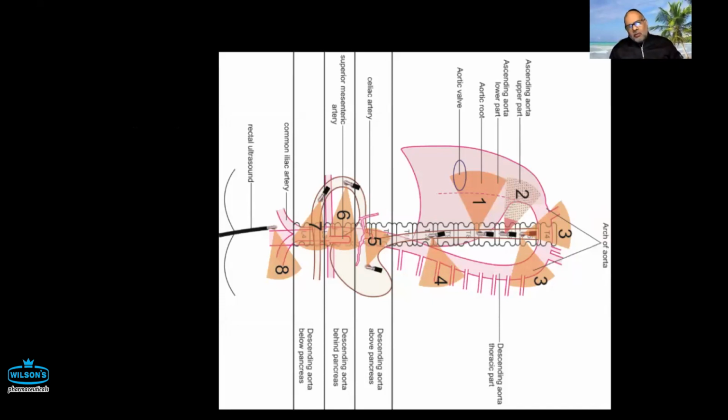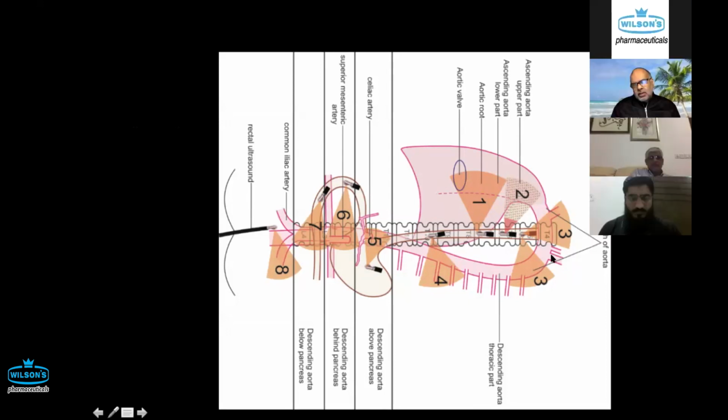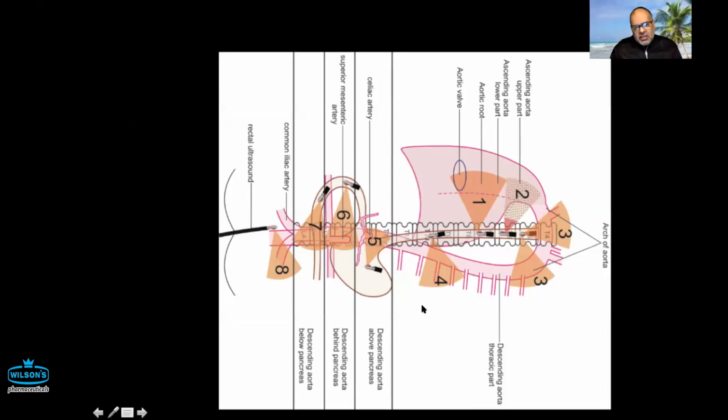Okay, so here's one thing which I want to share with you. Most of the time, what you will see in the images or in the books is that you have this image which is upright. I've intentionally put it on the side. The reason is that this is how the patient is lying down, actually. So if you look at that, that's how the patient is. The aortic arch goes like this. The spine is posterior, and the esophagus is like this, and goes there, and the fundus is like this. Now, this helps you to orient. So that's why I put it here.